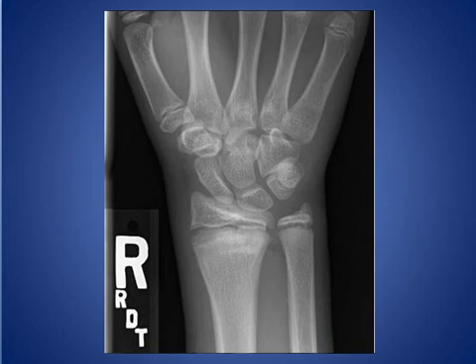Here, this is a 12 years old child. He has wrist pain after gymnast exercise, and we see there is some irregularity of the epiphyseal plate with some sclerosis, and we call it gymnast wrist, and this is Salter-Harris fracture type 1 of the distal radius.